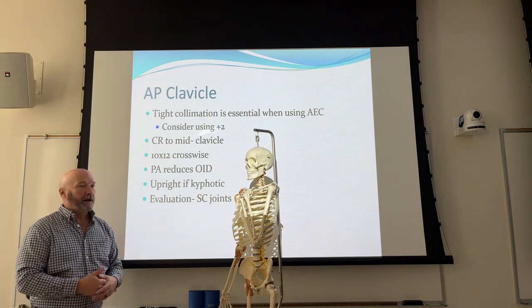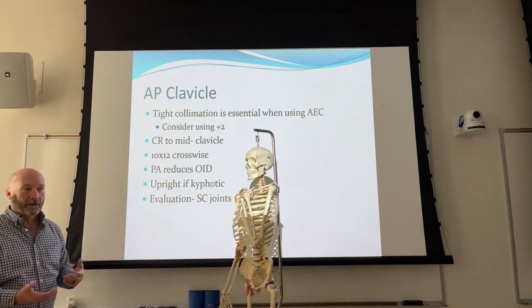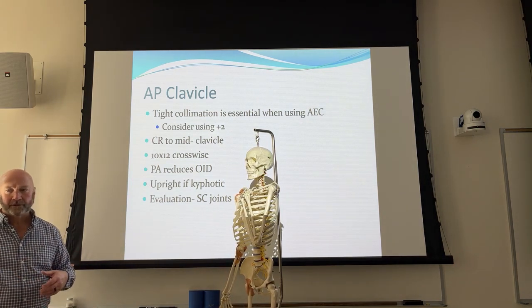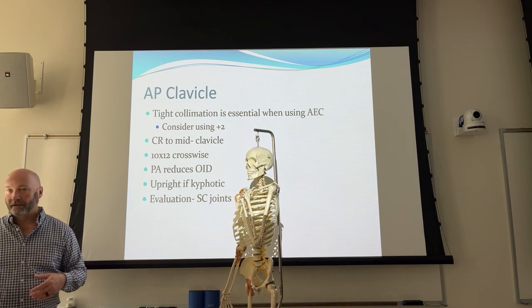So if the patient's kyphotic, you're going to have a hard time with your clavicle for two different reasons. One is that if you got a kyphotic patient, they're going to have a hard time laying flat on their back.